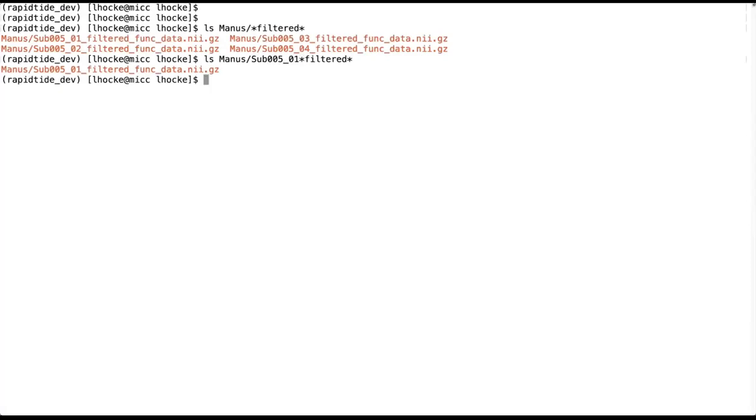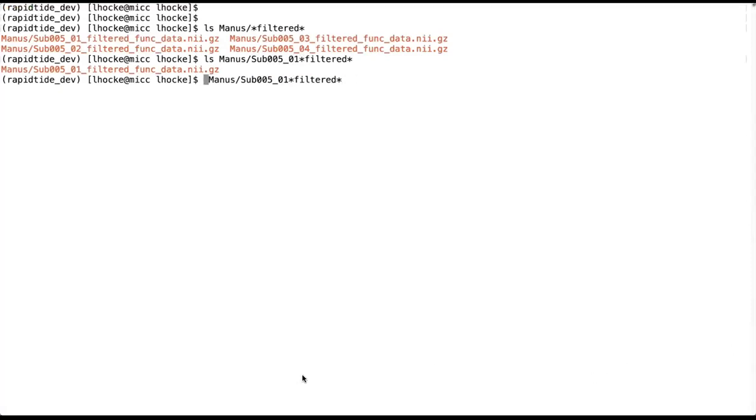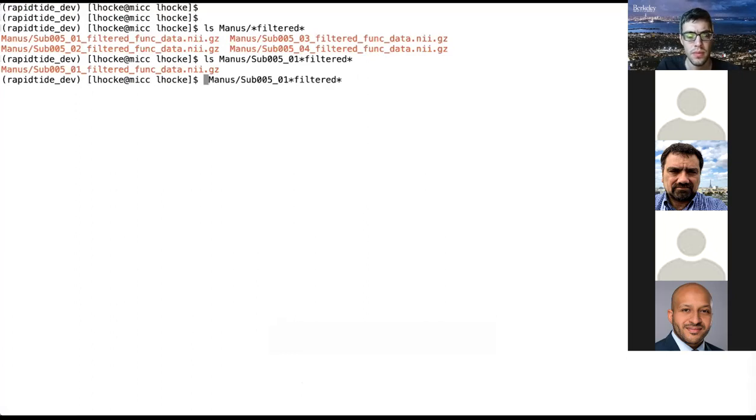First, let's look. So, just saying, the Moyamoya example I have here, as described in the program, you can download in the Slack channel. It's directly there, and there's all the output too, which I'm going to go over. So you can either just tag along or you can watch and later do it. The example NIfTI files and everything is there.